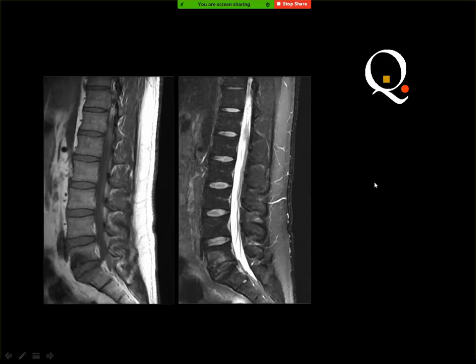of the spine. And can you see the lesion? Anybody? Modic type 2. Yes. Where? In L5S1. Okay. And we have the lower end plate of the L5. Okay.